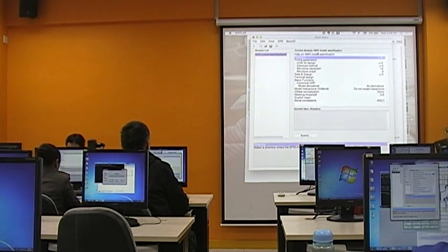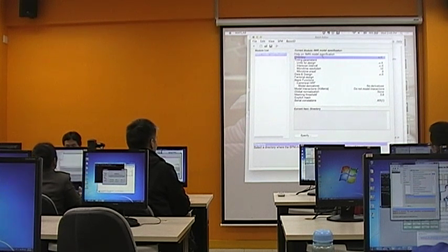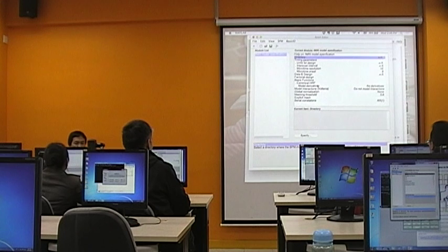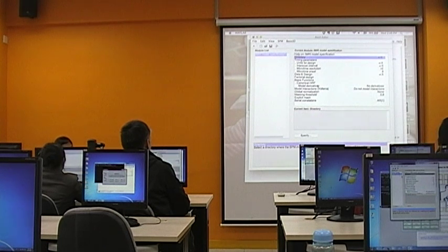Okay. So I just click on the fMRI model specification in this case. These are all what you need to specify a first level model for one individual subject. Now remember, you assume that you have 15 subjects, which means that you need to do this 15 times.